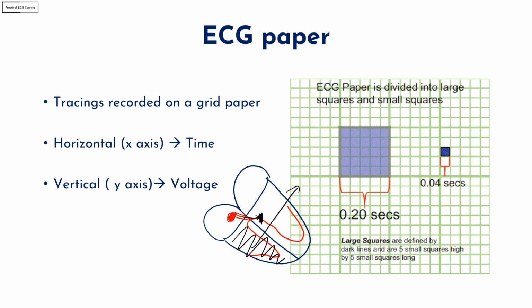And how would this be reflected on an ECG? It would be reflected as an increase in width of the QRS. So the first and the most important criteria for the diagnosis of an LBBB is a wide QRS. The same principle is also applicable for an RBBB. So if you want to diagnose any bundle branch block, be it right bundle branch or left bundle branch, the first criteria that you must be aware of is that the QRS is wide.